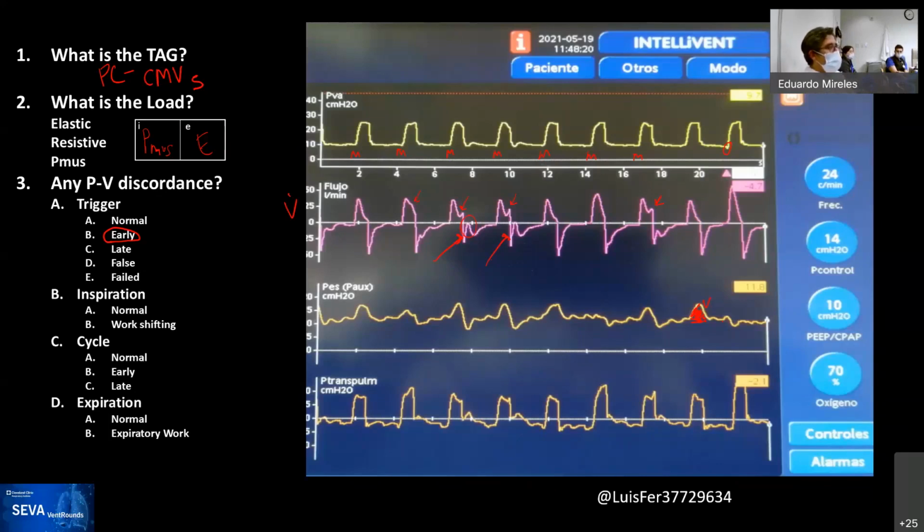Excellent. So the point being, in terms of taxonomy, how would you classify it, right? I do think, talking about what Rob is saying, and this has also been published by the group in Boston, there are differences in where the early trigger happens. You actually have here different types. You have one that occurs very early, one that occurs almost at the end, and we don't have one which happens during expiration.